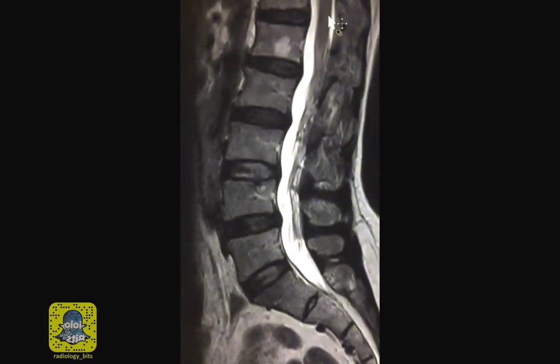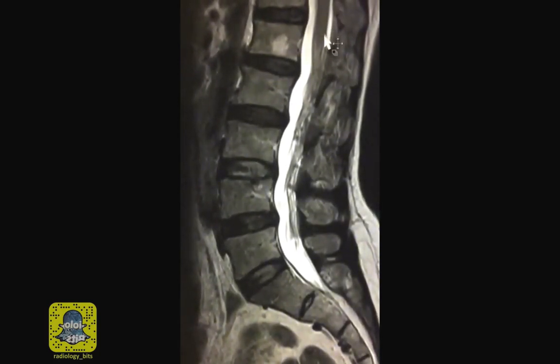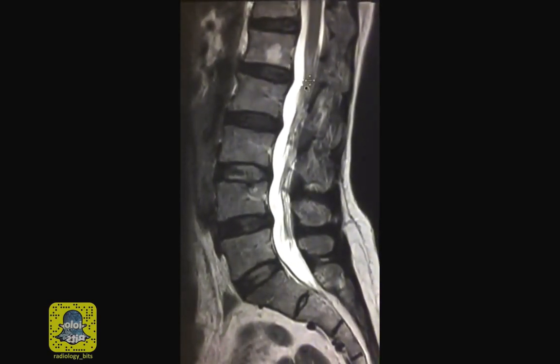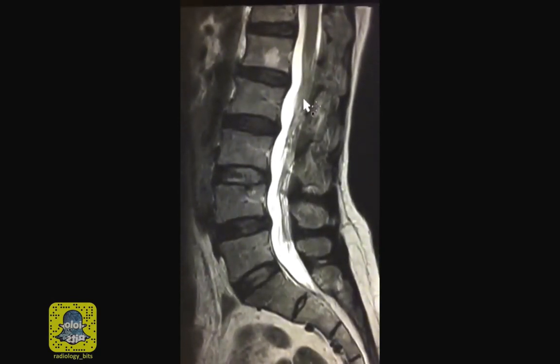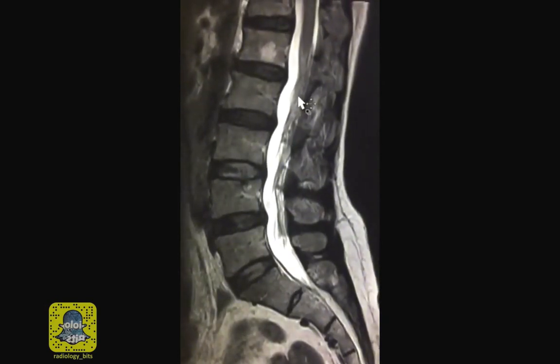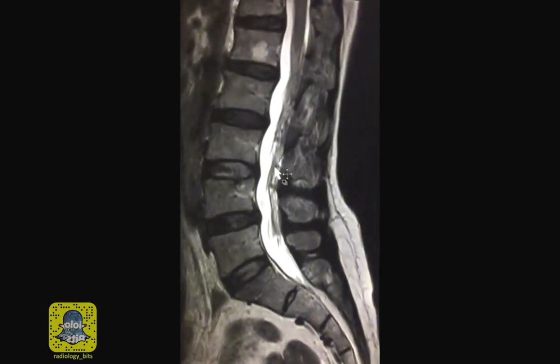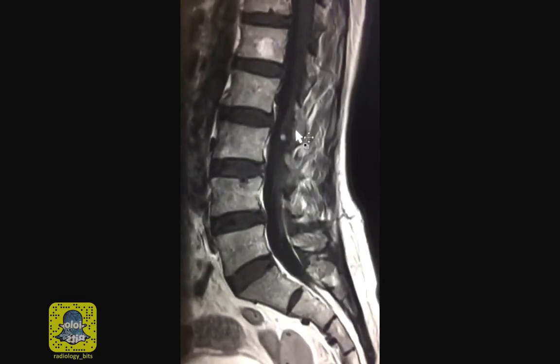Now let's summarize what we talked about today. First, we revised the cord anatomy. You have the cord, the conus medullaris, and cauda equina. Second, we agreed that CSF surrounds the cord in the thecal sac and that you could see the nerve roots very clearly on T2. The third teaching point is important for seniors. You have to make sure that the nerve roots of the cauda equina are smooth without nodules, even on a T2 image. And if you suspect that, give contrast.